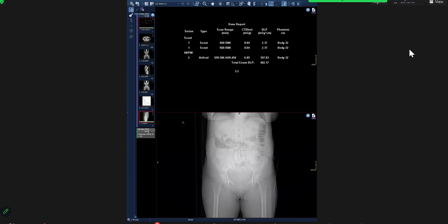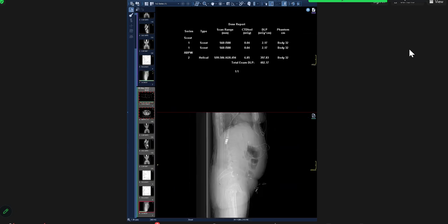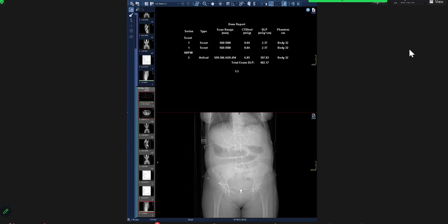But usually, whenever you are looking at a case in your routine practice, here you can see the small bowel dilatation really well. So first of all, decide: is it small bowel? Is it large bowel? Is it both? If you see small and large bowel both, then try to go down the large bowel, because it might be an obstructing carcinoma. Sigmoid cancer really presents with bowel dilatation all the way up, and you might see liver mets in that case as well.